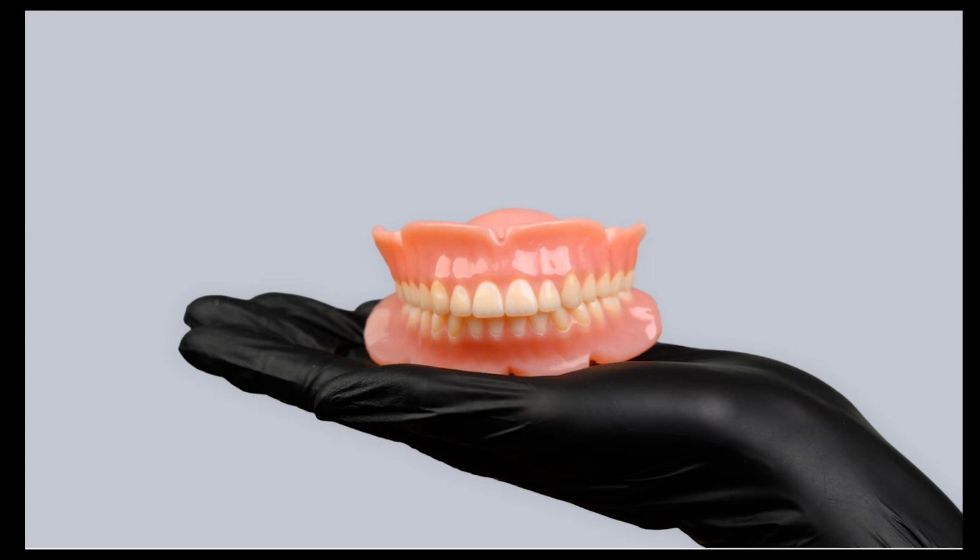This is both the general true step-by-step and specifically for TrueVoxel, because I try to throw in some tips and tricks on how to make your process in general a bit smoother. So loading dentures is done as usual, either through File, Edit Assembly, or Control-Shift-A. Add all the models that you want to have on the tray, and a quick cut to filling the entire thing with all the cases.